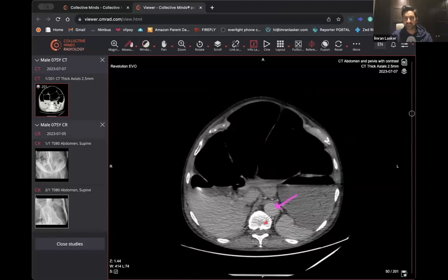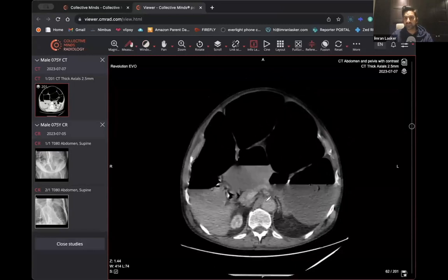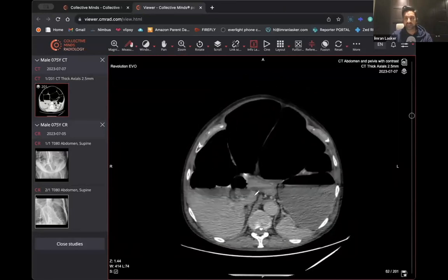If it's as bright as the bone, then you start thinking, okay, this must be an arterial image. This is not quite as bright as the bone. And actually, when you look at the portal vein, which is probably somewhere squeezed around here, and you compare the two, that one to that one, this one looks a bit brighter, doesn't it? So therefore, this must be a portovenous image.